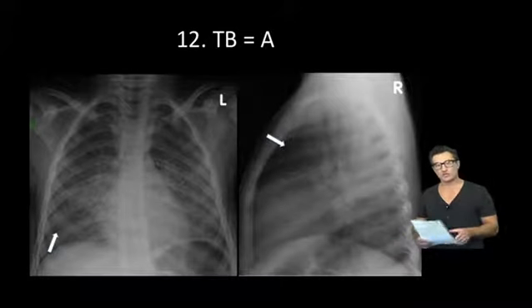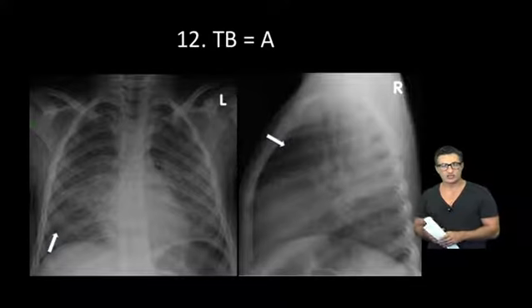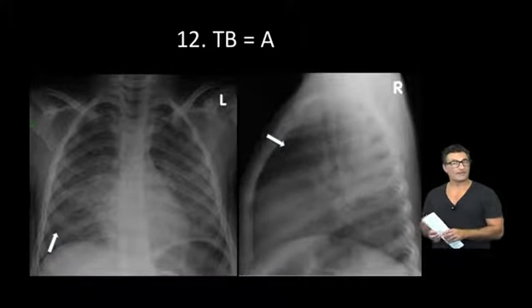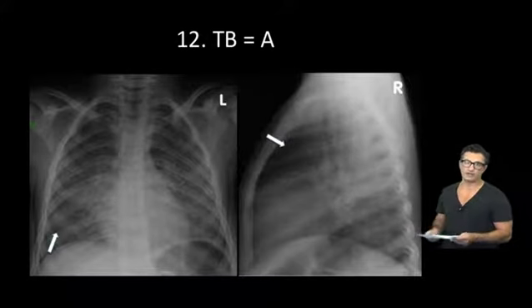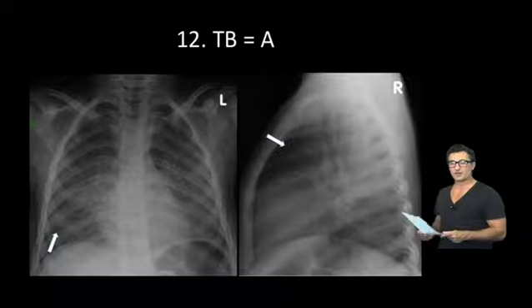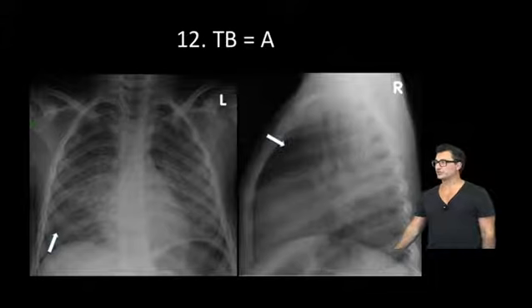There are other conditions that cause little dots on the chest X-ray, but in the situation we're working with, if you see this, it's probably miliary TB. I have a lot of trouble distinguishing this from lymphoid interstitial pneumonitis in HIV patients, but usually those patients have a good immunity, and I don't often have to make this distinction.